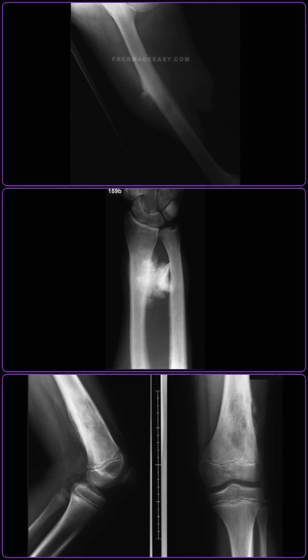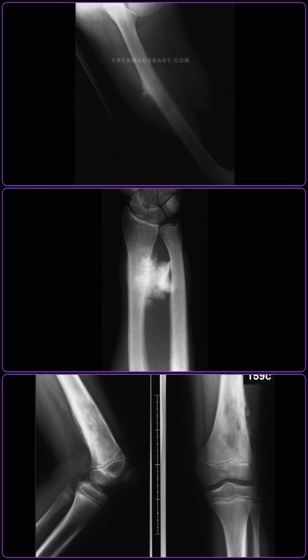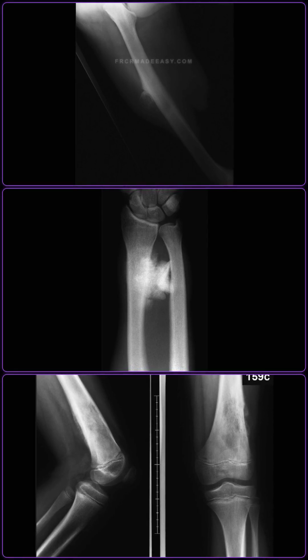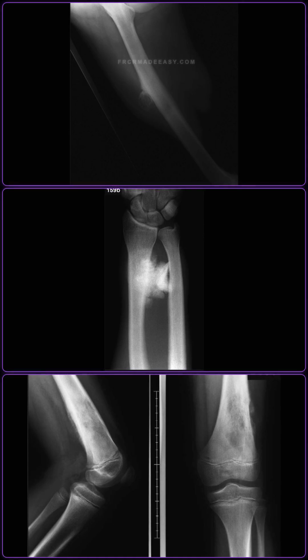surgical resection. How would you manage this patient as a radiologist? In that case, as a radiologist, I would recommend comparing these radiographs with prior studies to document the growth of the juxtacortical mass. I would recommend a dedicated MRI of the femur to evaluate for any medullary canal invasion, which is critical for surgical planning.